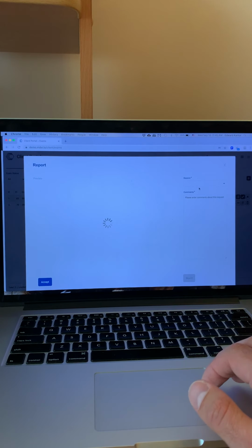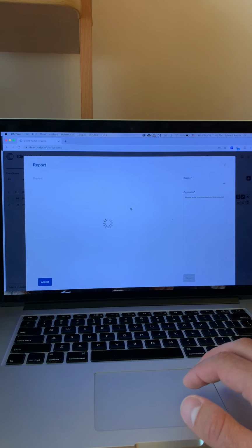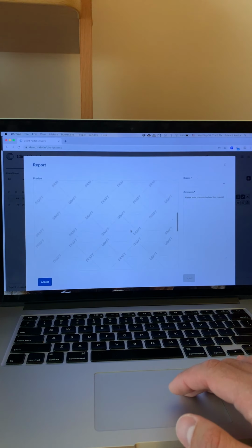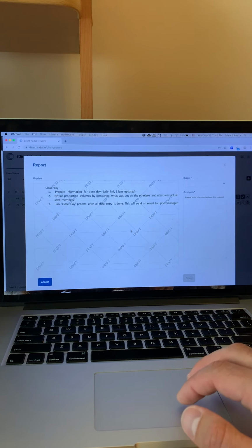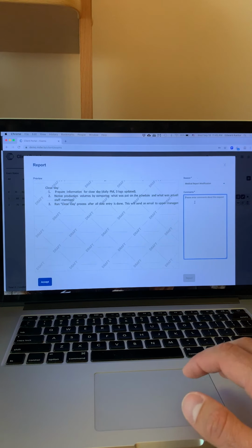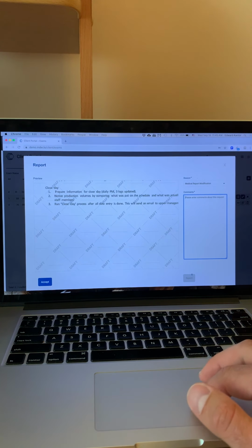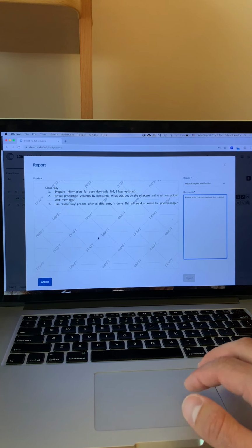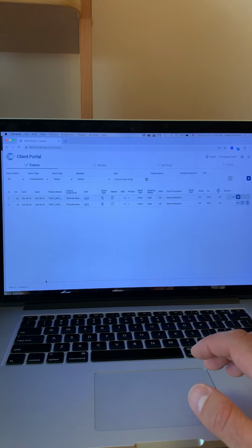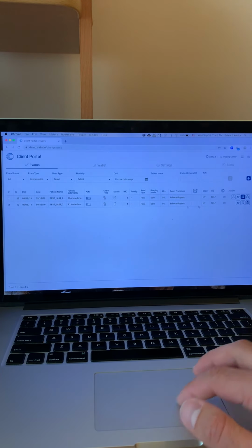When I'm viewing the study, it's a viewer that explains what has been read. Now I can either accept it or I can reject it. If I reject it, I need to specify the reason. In case something has been misspelled, I will need to specify it here and then click reject. At that point, the radiologist has to create an addendum and send it back here. But if I like the report and everything is okay, I click on accept. At that point, the study has been done.